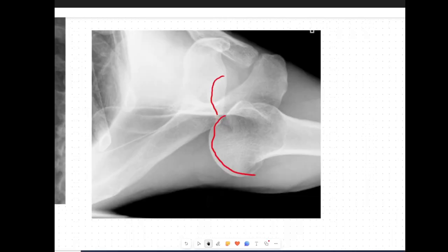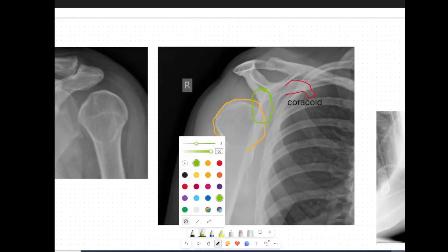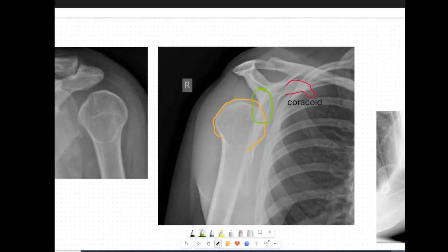Now, check the axillary view. This is the gold standard for spotting posterior dislocations. Here, the humeral head has shifted posteriorly, sitting behind the glenoid. It's completely out of alignment, almost like it's being knocked backward off the tee. And in the scapular Y view, the humeral head will appear behind the Y, clearly out of its central position. This misalignment should immediately clue you into a posterior dislocation.